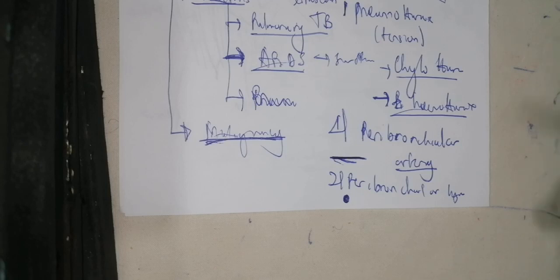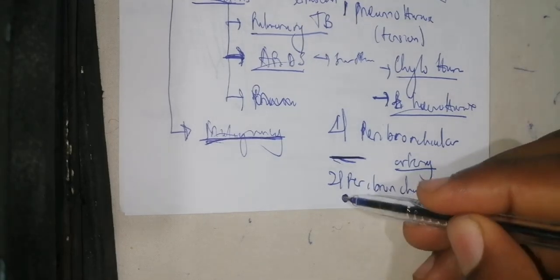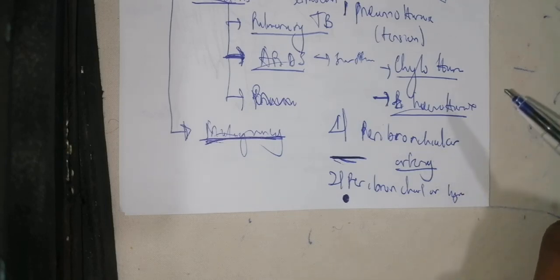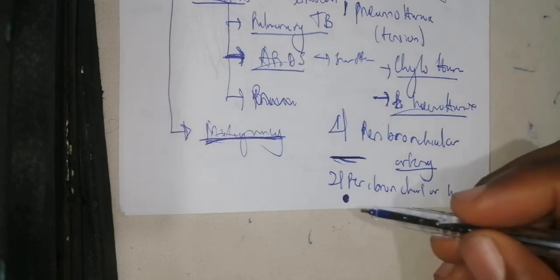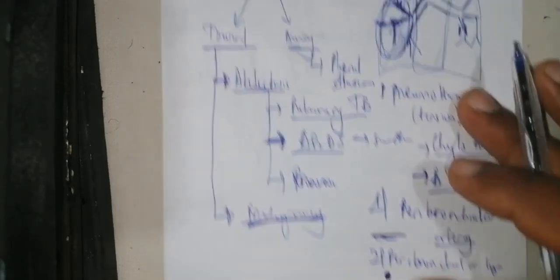Now when you see large peribronchial lymph nodes, we are not even supposed to see the peribronchial lymph nodes. Those are peribronchial lymphadenopathies. When you visualize peribronchial lymphadenopathies, it means that there may be an infection, a chronic infection, or there may be a malignancy. Is it clear? Or even an autoimmune disease. So those are the different things that you have to understand. Particularly this peribronchial lymphadenopathy, when they are diffuse micronodular reticular opacities, they are showing miliary tuberculosis. Is it clear? So those are the different things.